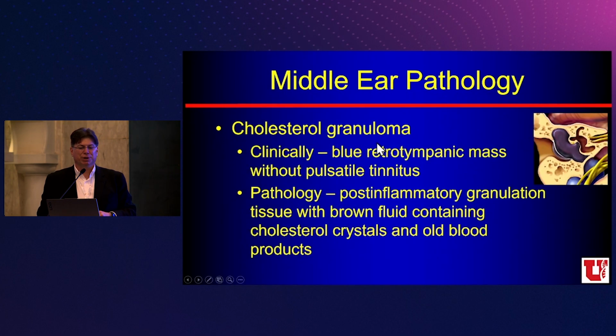Next, we have cholesterol granuloma. Clinically, we see a blue retrotympanic mass, but the patient does not have pulsatile tinnitus. And we think about this as post-inflammatory granulation. The surgeons say there are these brown crystals. It looks kind of like fat globules in that area.